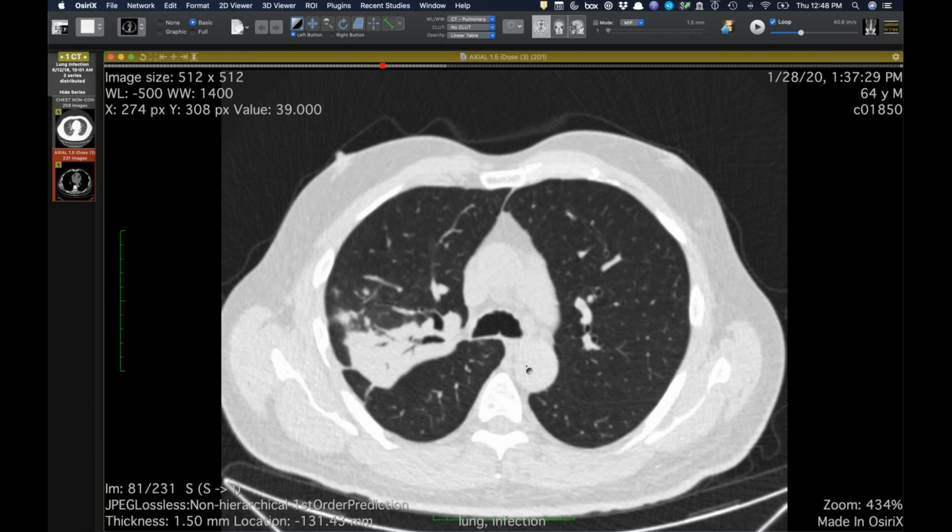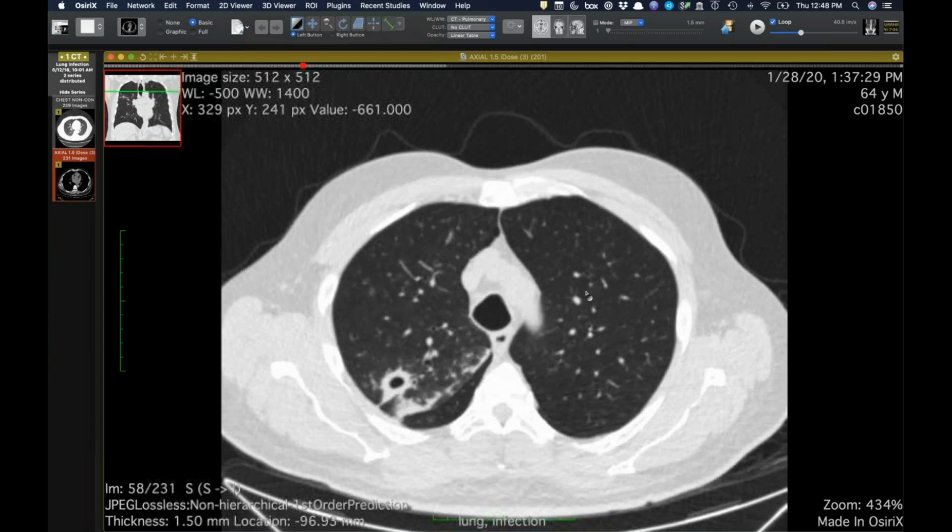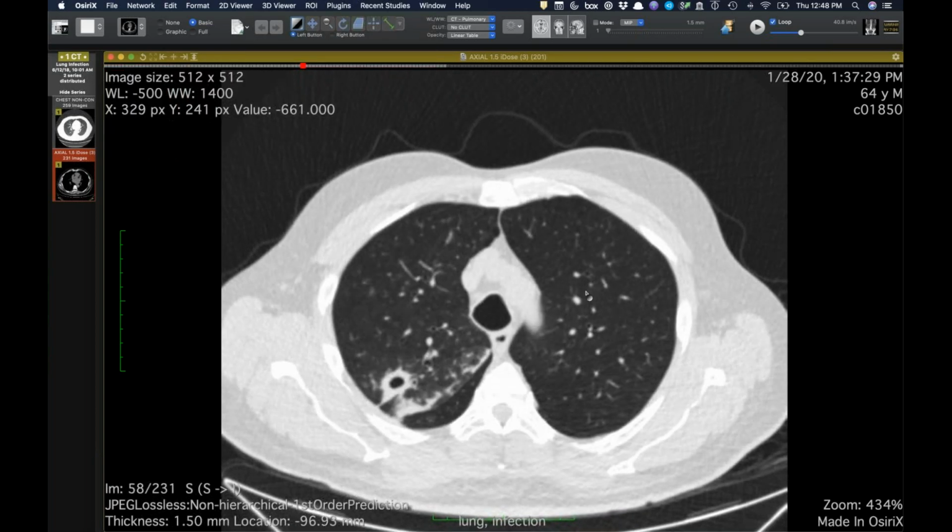Yeah, exactly. So, Travis, I think this case makes the interesting point that when you first catch MAC, if you catch it early, it's usually in this axillary aspect of the right upper lobe. The classic location that we think about with MAC is the involvement of the middle lobe and the lingula. That's pretty distinctive, but that's actually a late manifestation. The cases I've caught early have usually been in this region, which is right upper lobe, often halfway out toward the axilla. So this is a classic location for MAC to begin.